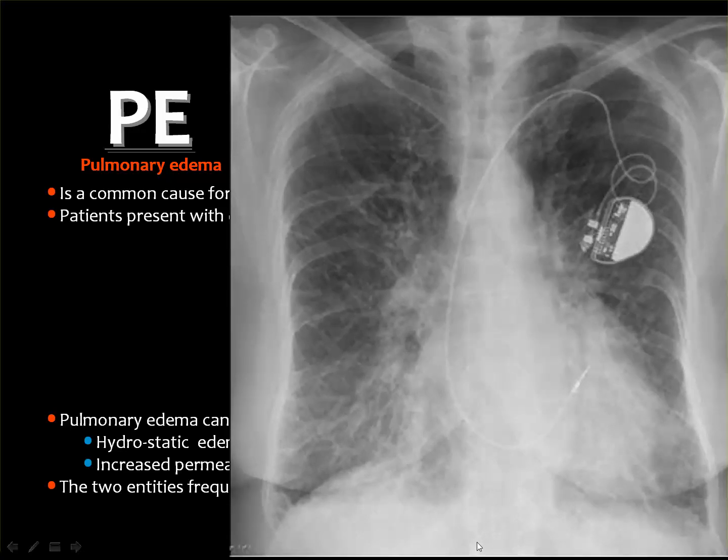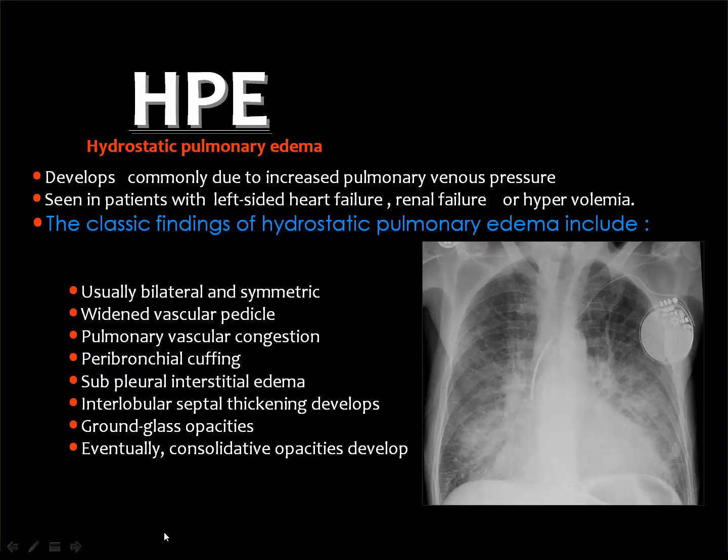Then the hydrostatic edema is the sequelae of left-sided cardiac strain, and it has well-known manifestations in the chest X-ray, which include enlargement and haziness of the hilar shadows, distension of the upper lobe vessels, and the appearance of Kerley B and A lines, the thickening of the interlobar fissures, the development of pleural effusion, the enlargement of the cardiac shadow.